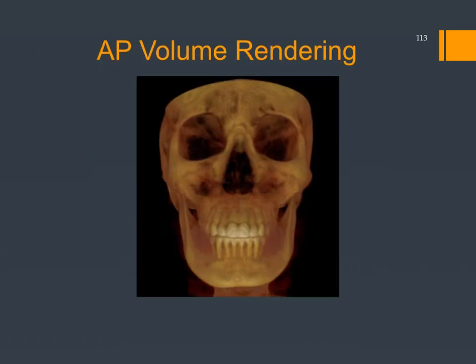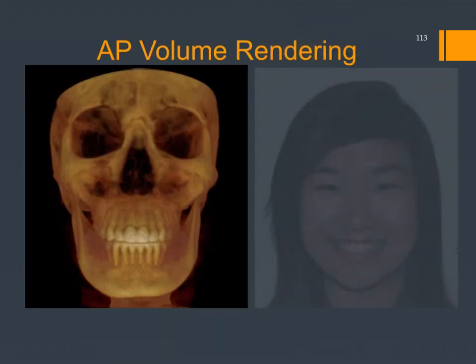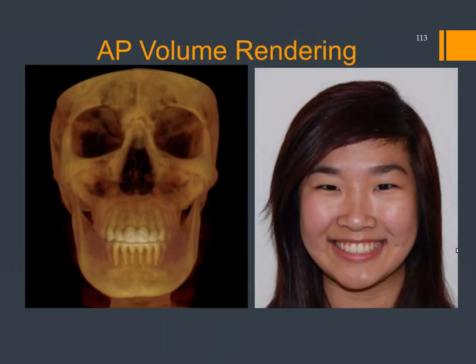And what about the asymmetry? Well, she still has a little mandibular asymmetry, but not really much, and certainly facially it doesn't show up at all. So this worked out, I think, well for her. I think it's just one more case that shows the value of 3D x-rays in treatment planning.